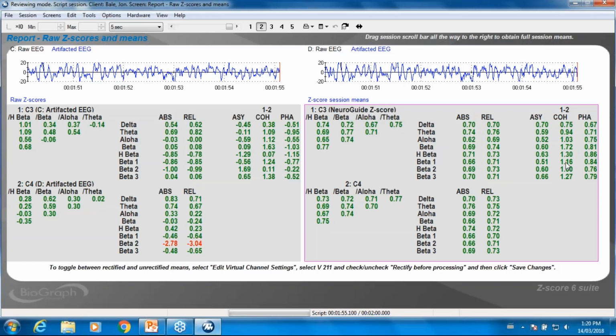All these numbers are pretty much below 1. A few of them are above 1. What this means is that they're all essentially less than 1 standard deviation away from the norm. All the results from Z-score analysis are always in standard deviations. So effectively, this is telling me that my brain is really boring and there's not much of interest right here. If the values were more than 2 standard deviations away from the norm, they'd be flagged in red, and the system would be telling me, hey, this value is remarkably far away from the average, we suggest you train this, depending on why the person's there.